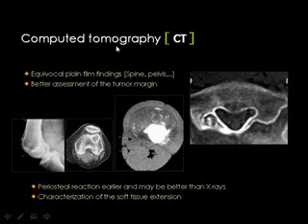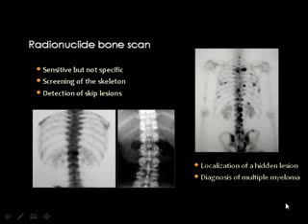Then, whenever you use CT scan, you are aiming at certain points, especially in the spine and the pelvis, where the plain film findings may be equivocal. Also, in assessment of the tumor margin, if it is sclerotic, like this osteoid osteoma and this chondroblastoma, and this tumor margin is ill-defined of an osteogenic sarcoma. Then to see the periosteal reaction and to detect the extraosseous soft tissue extension.